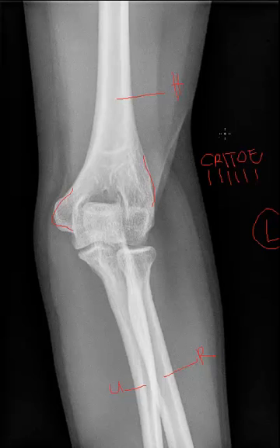And so these ossification centers should show up in this order. If you're seeing, for example, what looks like an olecranon ossification center, however the radial head ossification center has not appeared yet, you know in fact that the fragment you're seeing is a fracture. So this may be useful. I'll do some pediatric tutorials in the future. However, I felt that it was important to mention that.